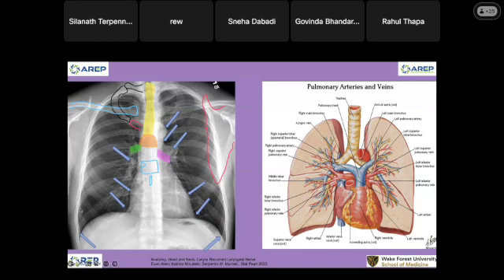Okay, this is a normal chest radiograph. First thing first, very good penetration, good exposure. Here is the rib, and this is the costophrenic sulcus. This is the costophrenic sulcus, the lateral sulcus that I am asking you about. And then we also have the posterior phrenic sulcus.